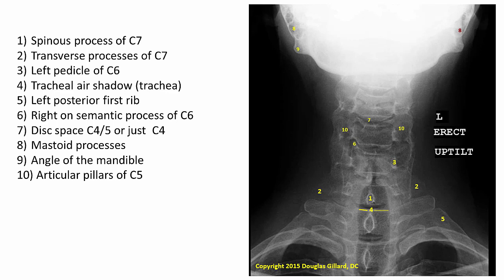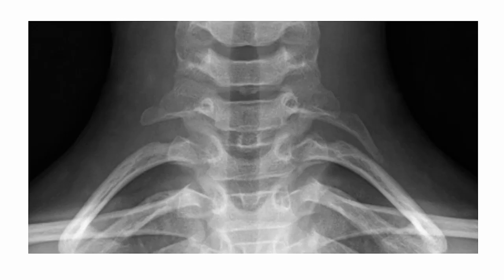Let's have some fun here. Let me let you look at that for a minute. You're going to see that some of you in this class, one of you is going to have, maybe not this pronounced, but one of you is going to have this condition. And it can lead to a condition called thoracic outlet syndrome, which I'll talk a lot about. Dr. Feinberg will talk to you a lot about when we get in CC4, and I'll reinforce that in lab. I think boards like this condition, although it's kind of debatable, this thoracic outlet syndrome, about how real it really is.